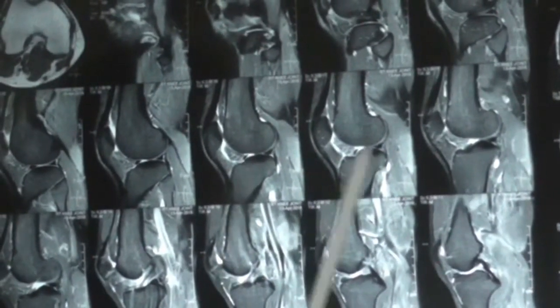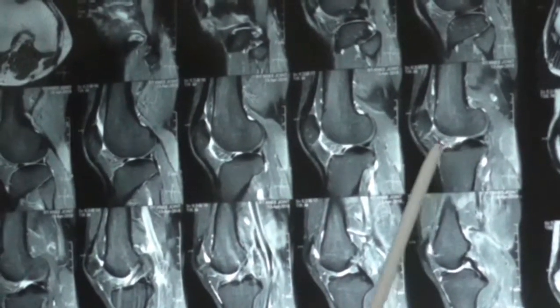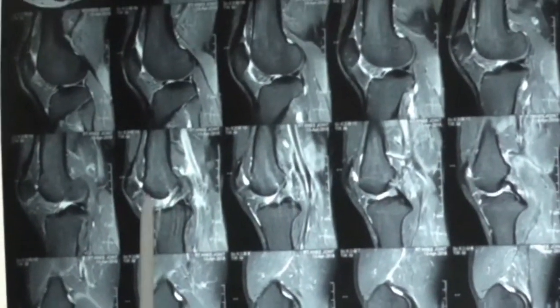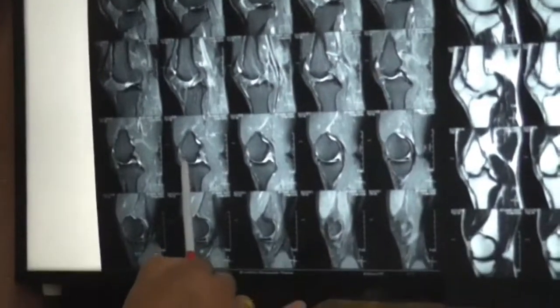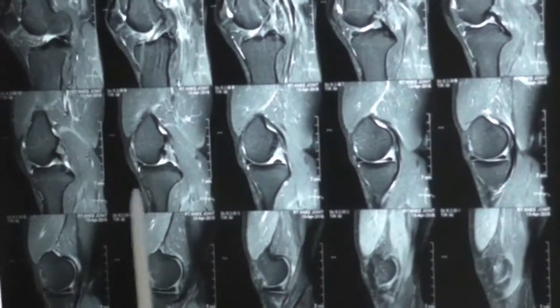So once the horn finishes, then starts the notch. In the notch area there is no meniscus; rather we'll see the ACL and PCL. I will not go into the ACL and PCL at this moment. I cross this notch area and go across and find that then starts the medial meniscus. So this is the medial compartment now.